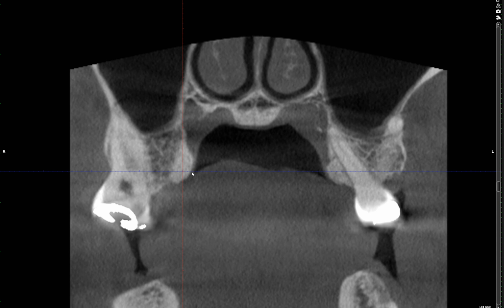Whereas it becomes markedly thin over this area. Therefore, if you're taking an alginate impression or any sort of an impression of the maxillary arch, it is important to avoid the tray running into this soft tissue, as it can cause a lot of pain and discomfort for the patient.